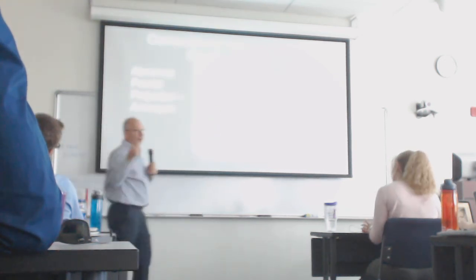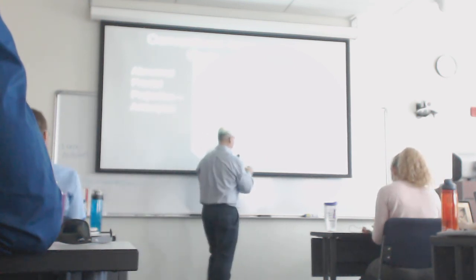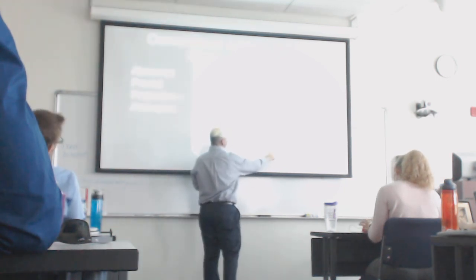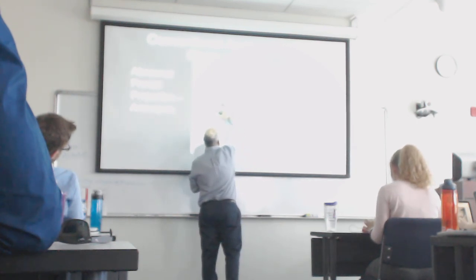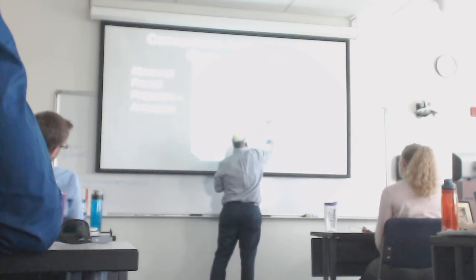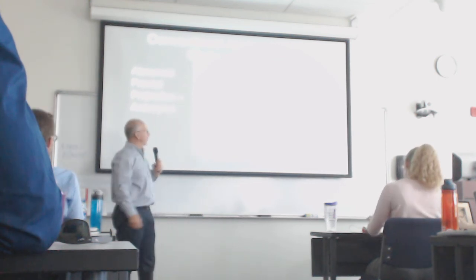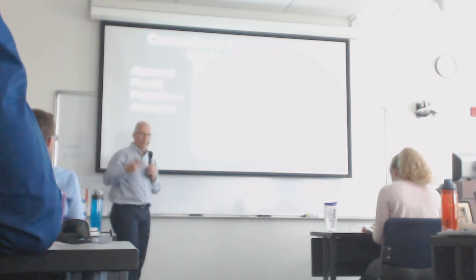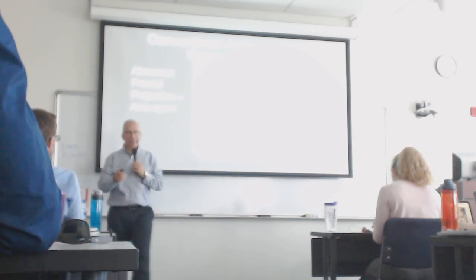Here's a conventional arteriogram of the intracranial circulation. Here's that internal carotid artery, just showed you here. It goes up there, and now here it comes through the skull base, and then it divides into the anterior cerebral artery and the middle cerebral artery. Notice how there's this big blob sticking off the middle cerebral artery. That's a big aneurysm. That is definitely something that gets clipped. So a neurosurgeon goes in there with a clip, puts a clip at the base, thromboses this, patient lives happily ever after.